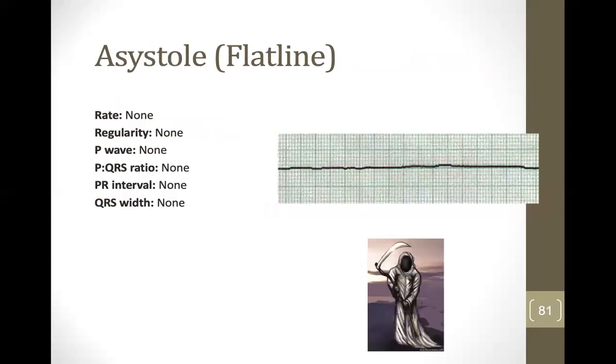Well, here is our flatline. Flatline means no electrical activity. Well, with no electrical activity, there's nothing that we can stop, right? We can't stop no electrical activity, which means in all the movies and the TV shows that you see where somebody is flatlined, right?